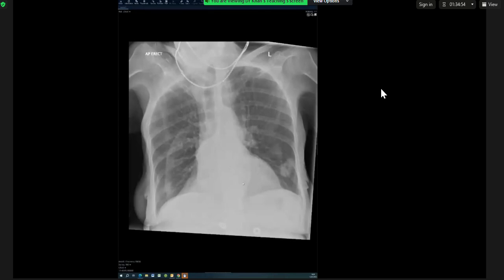Sometimes, and it's a tricky case, we would offer the history straight away to guide your thinking down a certain track. But if it's a straight away malignancy, we want you to ask for the history because the case is simple. You need to approach it the right way. So, for example, if it's on your reporting file, you pick it. If you miss it, it is an unacceptable miss. Yeah, even without the nodule in the left lower lobe, you have to pick that cancer.